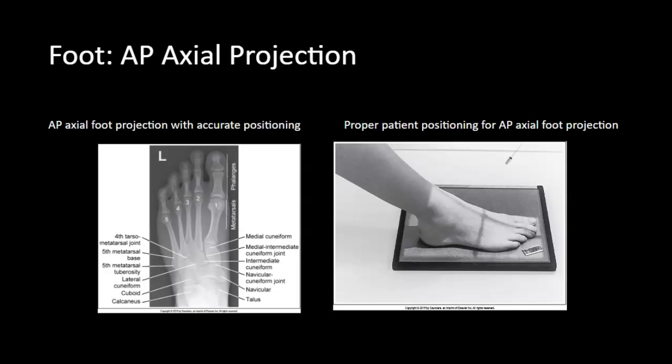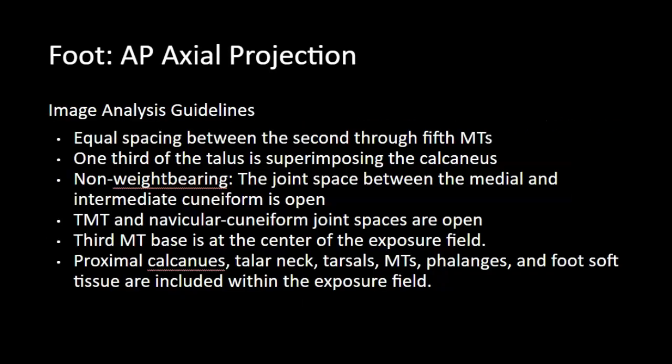Proximal calcaneus, talar neck, tarsals, metatarsals, phalanges, and the foot soft tissue should all be included within the field of view. I have included the image analysis guidelines within the presentation.